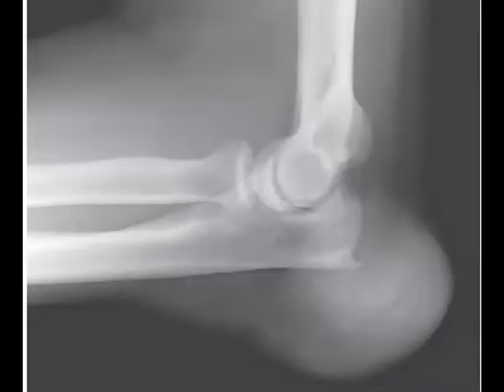So you know that gout is related to urate metabolism, and you will search for uric acid crystals, either in the joints, tissue or body fluids. Okay, so let's move on. So again, there is some fragmentation and soft tissue, the same case.